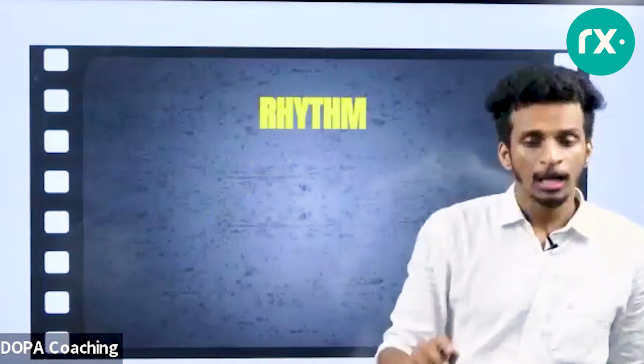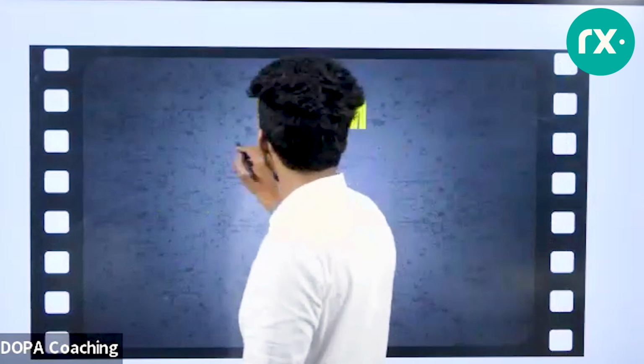Now, let's speak about rhythm. We can have two types of rhythm in an ECG. One can be regular rhythm.